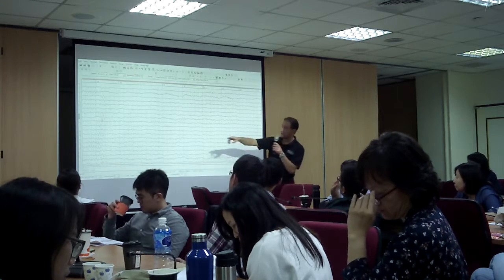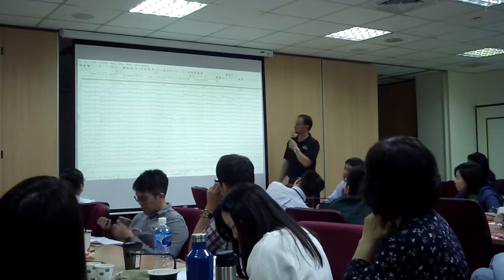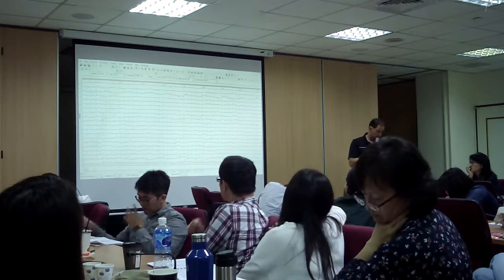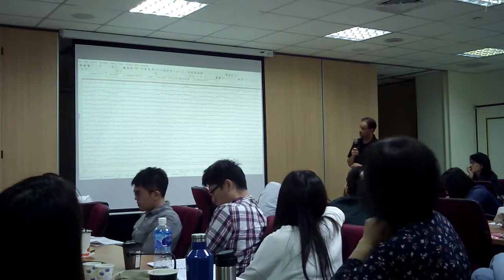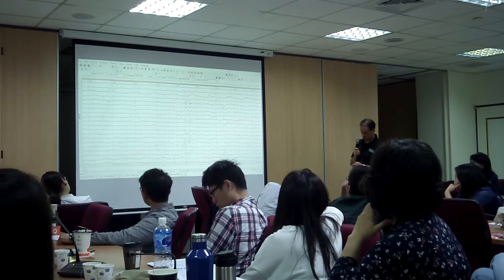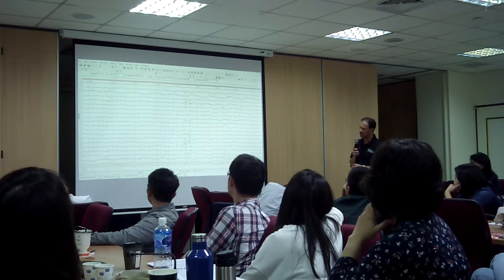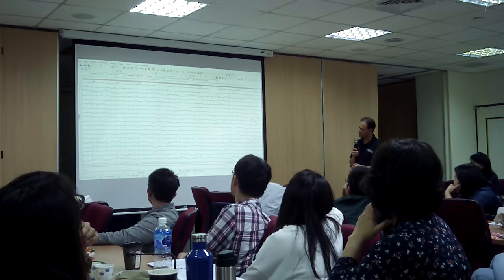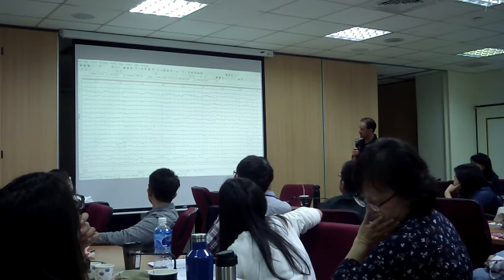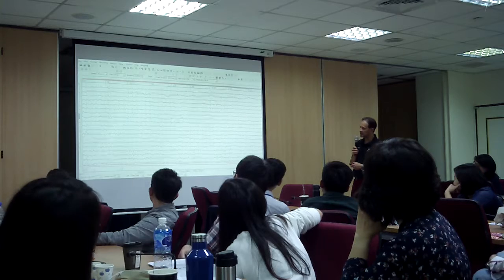And again, you see it here, and you see the discharge here again. So that's significant, okay? And what could it be? What do you think it could be? You see it there. It's mostly at T3. F7 and F3 are affected, but it's mostly presented at T3. So what do you think that could be? There it is again.